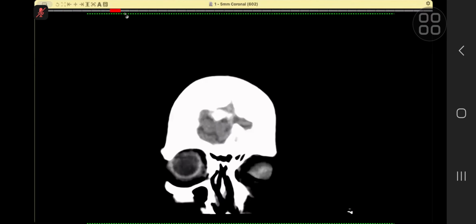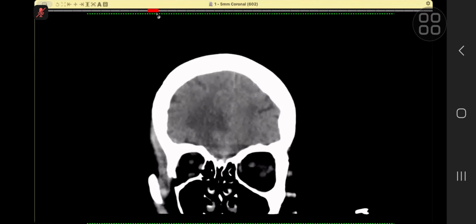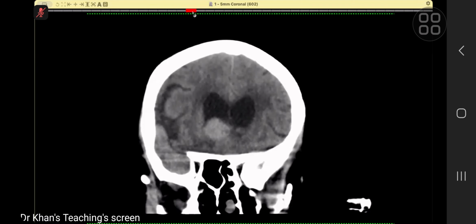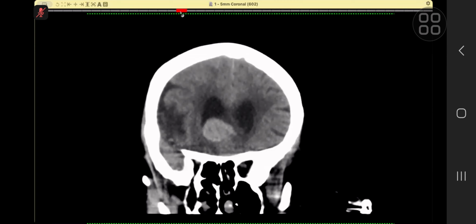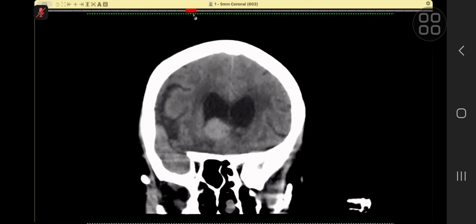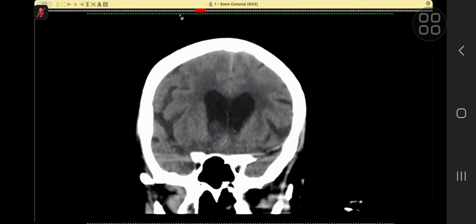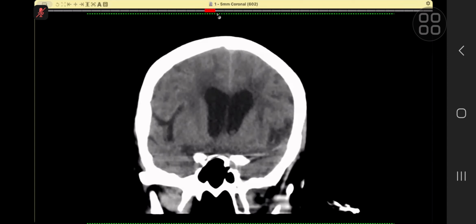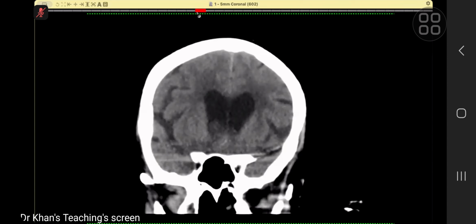I would like to further inquire about the history of the patient. I've given you the history. Yes, the patient came to A&E, is 74, and the NIHSS is 7. This was asked by the stroke team. This could also possibly be a ruptured aneurysm. However, there is no evidence of any obvious SAH seen in the basal cisterns or sylvian fissure in that region.